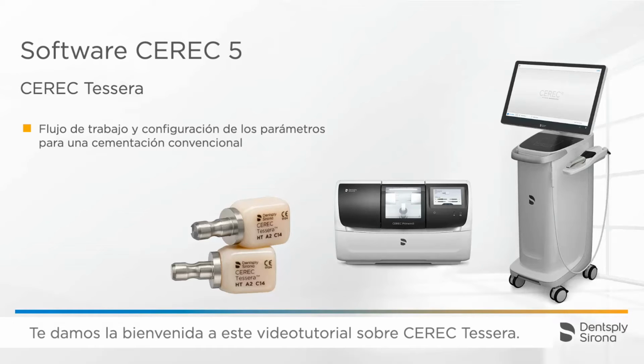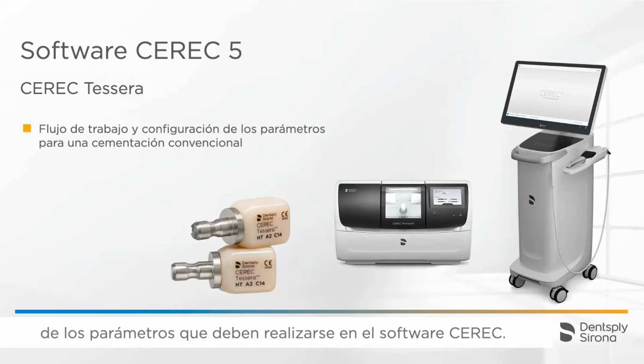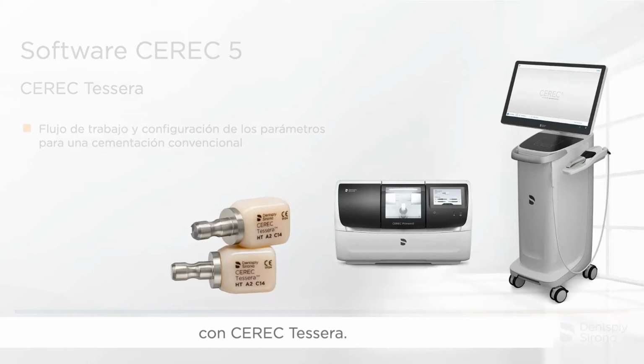Welcome to this video tutorial on the topic of CEREC Tessera. In this video, we would like to show you the workflow and the parameter settings to be observed in the CEREC software, especially in the case of conventional cementation with CEREC Tessera.